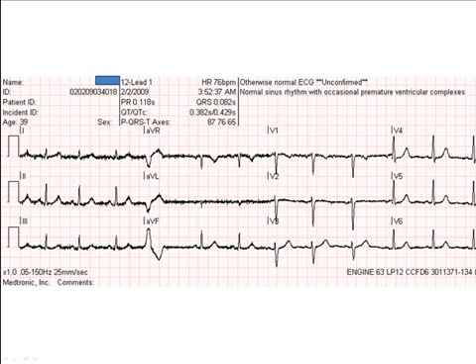It reveals a sinus rhythm with a rate of 76. It's not too fast or too slow. A 12 lead is obtained and you see the series of strips. After confirming that the monitor was in diagnostic mode and the calibration was correct, you glance at the heart rate, which was 76. You then look at the QRS duration, 0.082 seconds. Normal. You now look at the inferior leads for ST elevation.